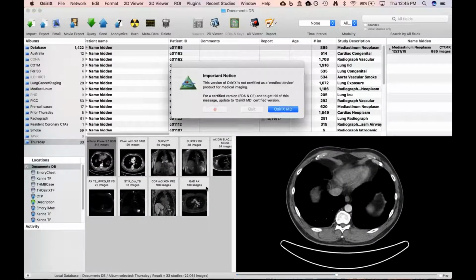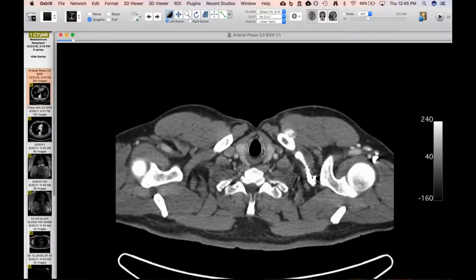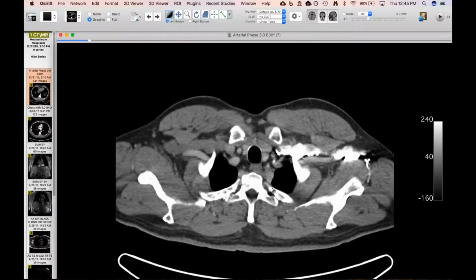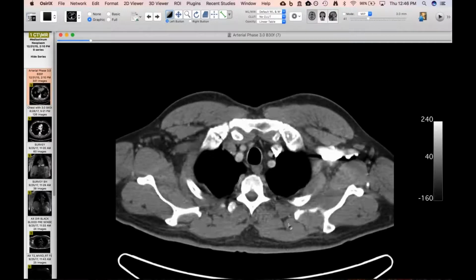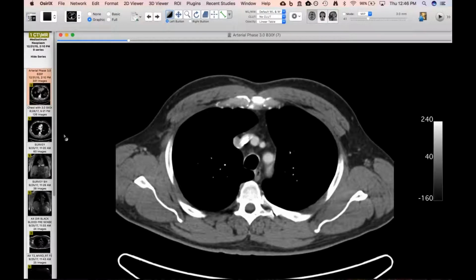This one's not that exciting, but then that'll give Jeff the last quarter of an hour. I think this one's more of just a reminder. Now, this guy had trauma to his shoulder, which is irrelevant to this. This is 2015, and he had this subtle little thing right here, which is not just a vessel. You can see an intercostal vein on the right.